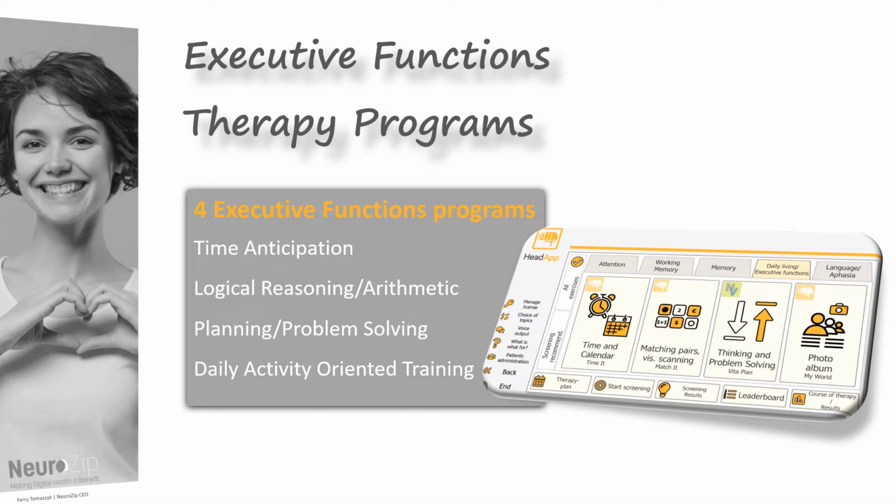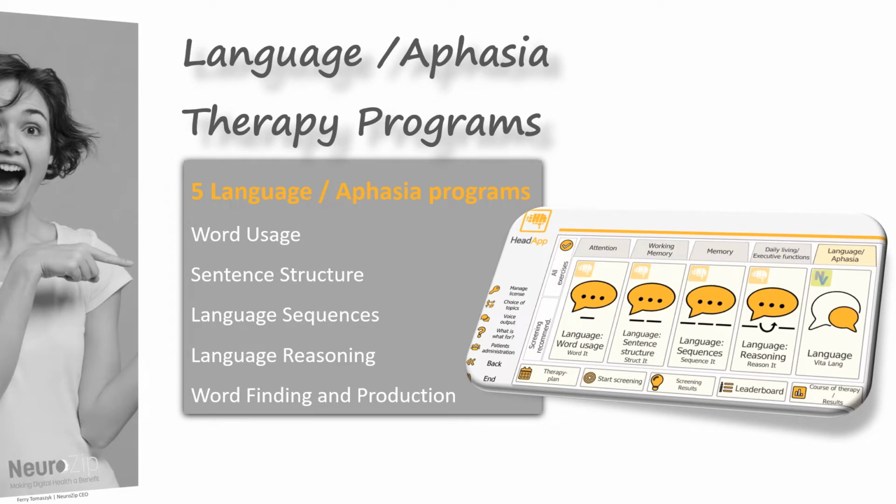Therapists are provided by 4 exercises with close to everyday life templates in order to train and strengthen time anticipation, logical reasoning, problem solving, and daily activities. Last but not least, HeadApp provides the therapist with 5 language exercise programs to train word usage, sentence structure, language sequences, language reasoning, and word finding and production.